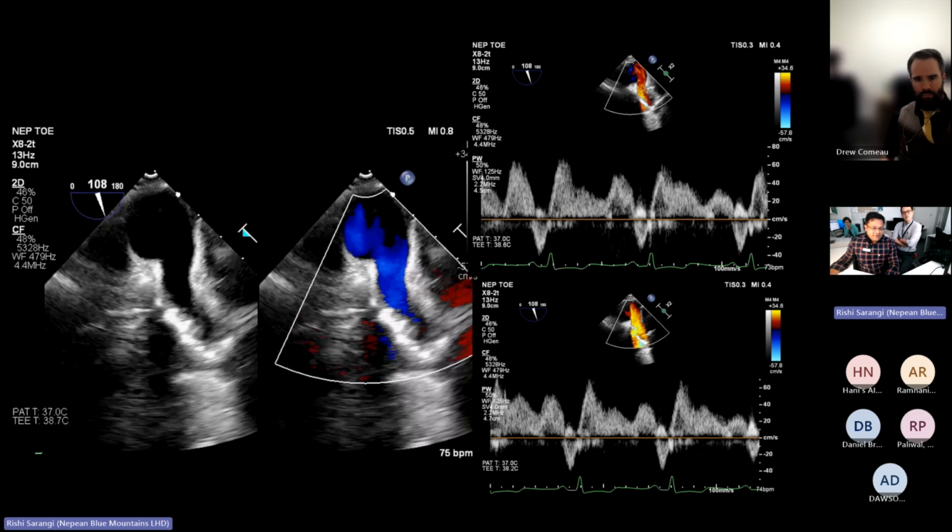So what do you think about the left atrial pressures? What do you think about the S and D waveforms? Looking at that, I can see the S wave is taller. It's still taller than the D wave. So that means we still have an S-dominant pattern, the S waveform is more than D. That means the left atrial pressures are not elevated. So it will be very hard for me to call this severe, or even moderate. So what we ended up reporting, which Sam would hate, was mild to moderate.